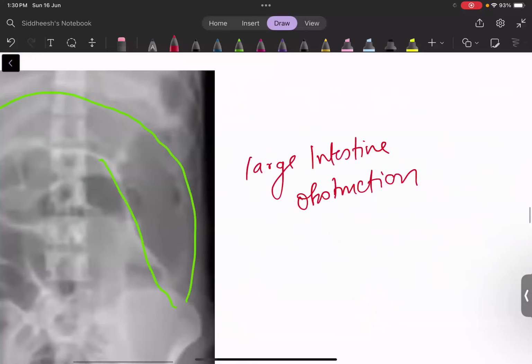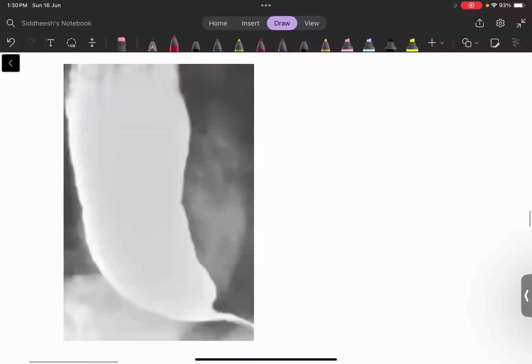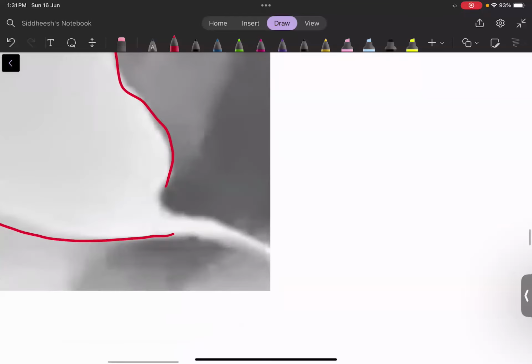Okay. The next image I am showing you is the esophagus. You will learn this automatically with experience. Now this is the esophagus, which is completely dilated. Correct? And can you all appreciate the smooth lining at the end? Yes or no?